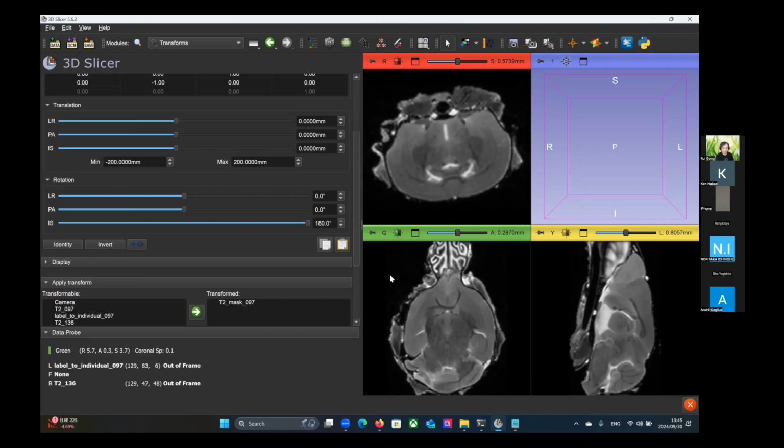About the orientation, we have the script that automatically rotates to the template that we need, but it's kind of weird, and I believe that's all the subjects that the provider gave to us, and they were like that. It's from before we actually changed something to the orientation in the Bruker, as far as I see. Okay, so because these data are old, they are fixed, and the latest one should appear in a proper way. Not to the human coordinates, we still need to rotate, but the rotation direction is different, I know. Yeah, I see.